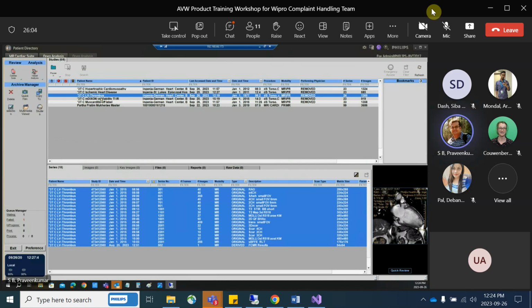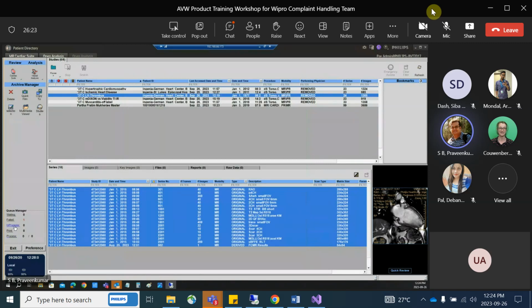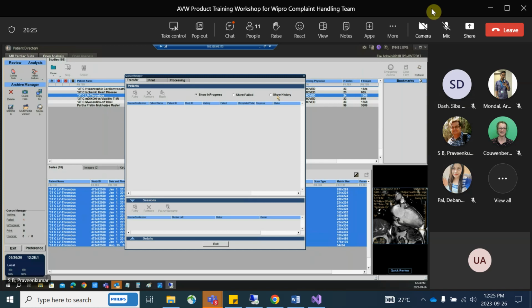So now I'm copying this study to some other folder. That time the application will start triggering. It will start triggering the results here. I'm copying this study to the SPP folder. There, the copying is done now. After completion of copying the study, it will automatically go in progress. It will show the pre-processing.